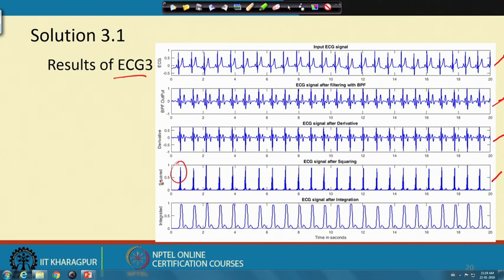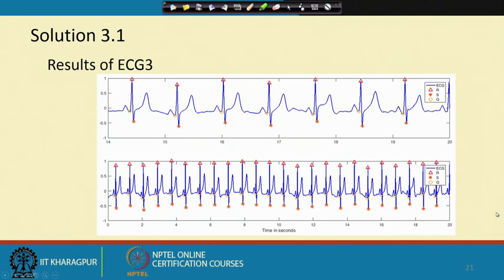So, we have passed it through a MA filter and we get pulse-like structures and clear separation between the small peaks and the high peaks here. Okay. So, here we get a very uniform view, if you look at the pulse heights, they are more or less the same. So, it is a very nice signal, we could get all the QRS peaks here without any error. So, these are the markings we show, showing how we could mark them.